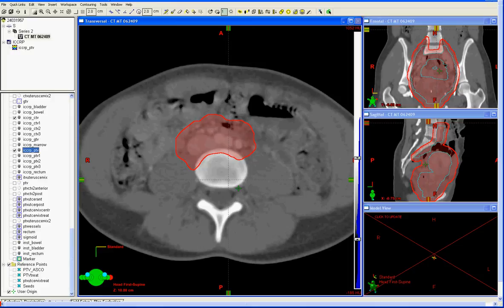This is Dr. Lauren Mell, Radiation Oncology at University of California, San Diego. This is an instructional video for normal tissue delineation for the International IMRT protocol. We'll discuss in this video bowel, bladder, and rectal contouring.